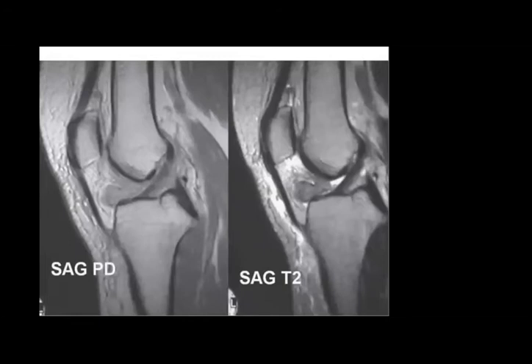Which sequence would you like to look for? Diffusion DWI. Are you sure? Yes, because of hemorrhage, spot of gradient. Yeah, so it would be SWI. Maybe it is better to mention gradient, it is easier for you, and to not mix.